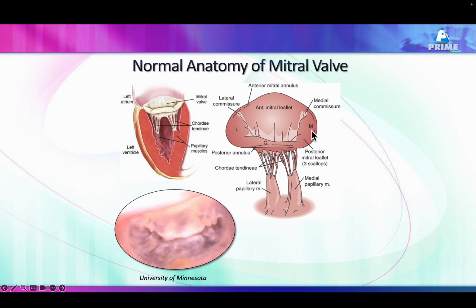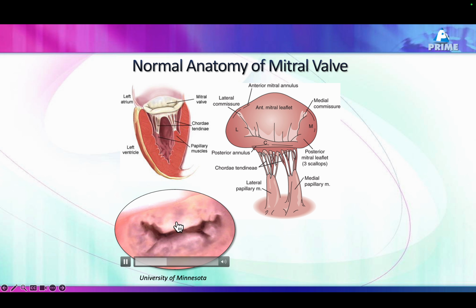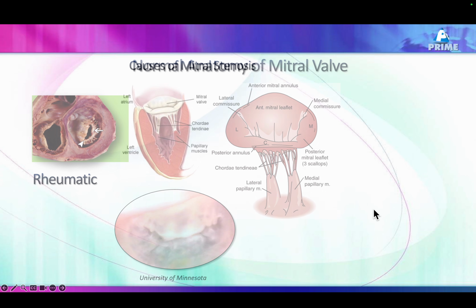Then you have a large anterior mitral leaflet. Remember, the anterior mitral leaflet is mighty and large. Why it's important in rheumatic heart disease, I will show you, because this is going to produce a posterior mitral valve movement anteriorly. So this is the posterior mitral leaflet, which has a larger circumference but is smaller in size, and it is associated with the chordae and the two papillary muscles, and that's how the mitral valve looks. The PML is smaller, the anterior mitral leaflet larger and mightier.